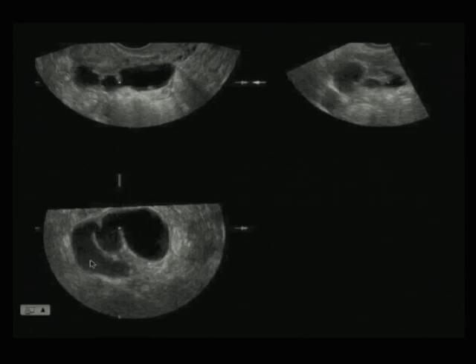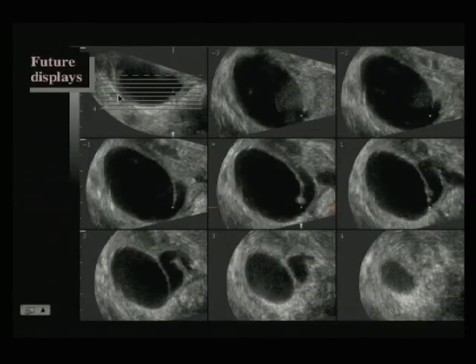The tube right here is filled with fluid, and it's just that the tube up here is going in and out of plane, and that's why you're seeing it as little cysts. But if you generate that reconstructed plane, which we've done in the third image, you can actually display the actual tube. You can also take a look at the tube in this kind of parallel slice imaging, and then that will also show you, as you glance through all these slices, that this particular cyst is a tube.